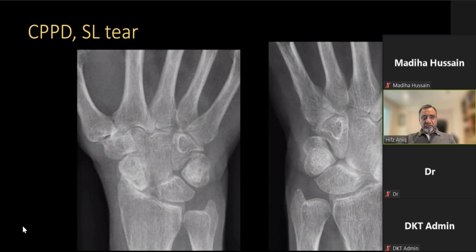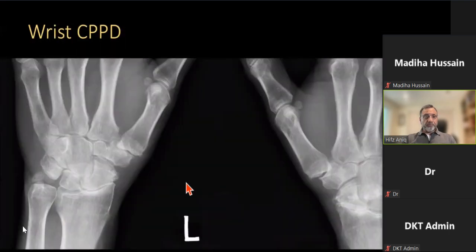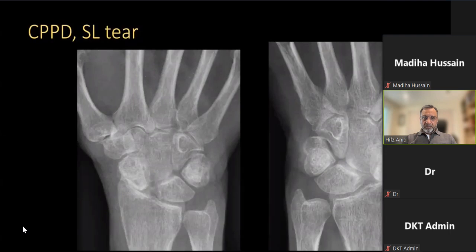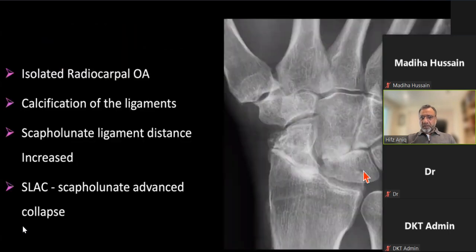With trauma, always get an orthogonal view because it may be a posterior dislocation. It sometimes may not look dislocated. Luxation can lead to a funny appearance of the lunate.